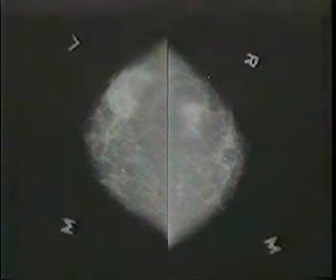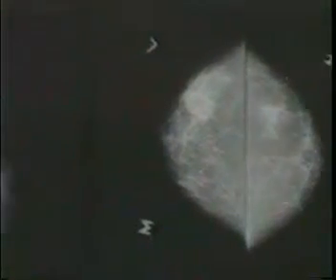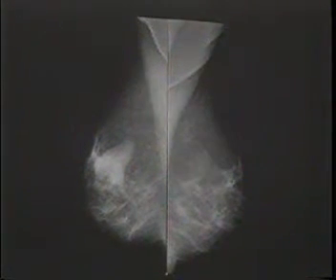If we examine this patient, which we do when we do a mammogram and it looks like this, we don't feel anything up here either. So we're comfortable that this falls into the area of asymmetric breast tissue. What we usually do with these women is if we can't get an old mammogram, we'll do a short-term follow-up, a 6-month follow-up on this side. Then she's back to her bilateral mammogram on the other side, and we put her back into the screening study, making sure she comes back for 3 years so that we can follow it. So that's how we deal with this.